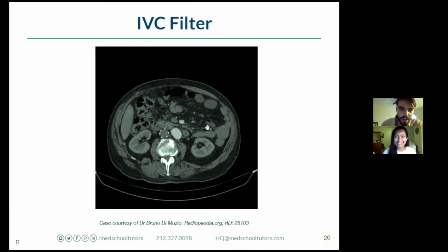Perfect. Yeah. Nice. As we go through here, I apologize. Why? Yeah, that's what I was looking at behind. What are we looking at here behind this?